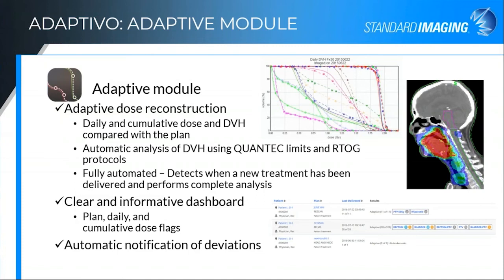That's all automated. We do that daily calculation, and then we use the same deformation map to take those doses back to the planning image in order to add together every day's dose to give you the cumulative delivered dose. So you can look at not only where did my dose go today, but also how are these variations affecting the overall quality of that dose distribution? Am I still within tolerance? Am I still delivering an acceptable dose distribution?